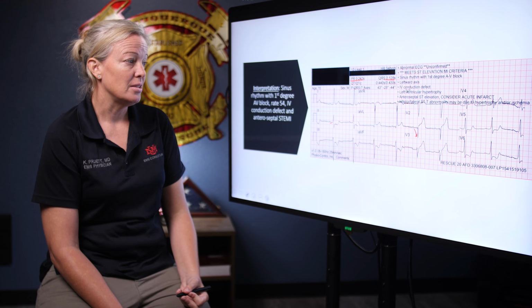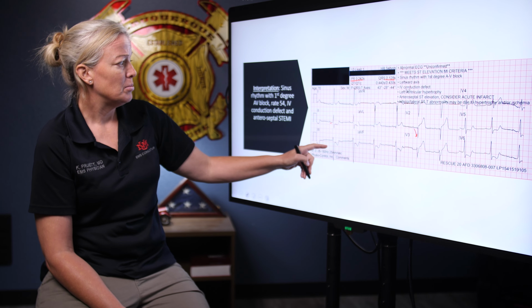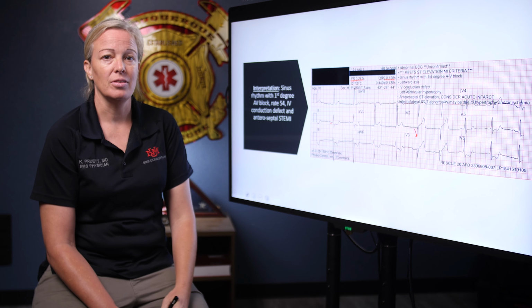But the big thing here, we see our anteroseptal STEMI with the ST elevation in V1 through V4 and the reciprocal changes in 2, 3, and AVF. So this is a STEMI alert.